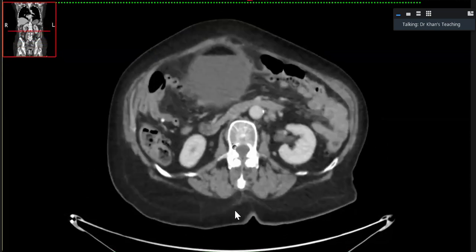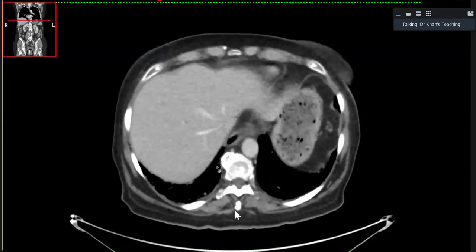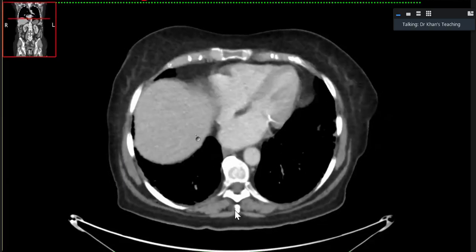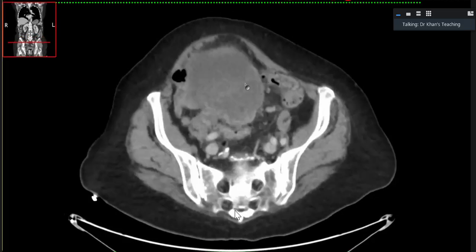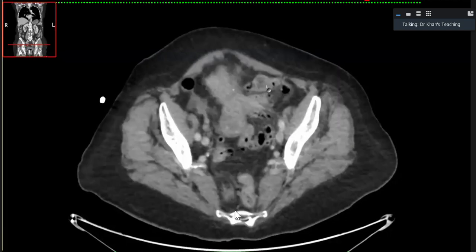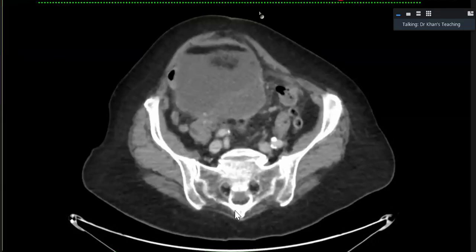If we go towards the liver, we can see some calcification sitting on the serosal surface, maybe part of the same thing. And here, this is that metastasis which we had looked at on the opposed phase T1 weighted sequence. As far as the main lesion is concerned, this is all fatty. As we go there, this is that ugly looking, enhancing, nodular, malignant type of mass. So overall, this case was an immature teratoma with hepatic metastasis and possible peritoneal involvement. The peritoneum part, of course, was not visible on MR.